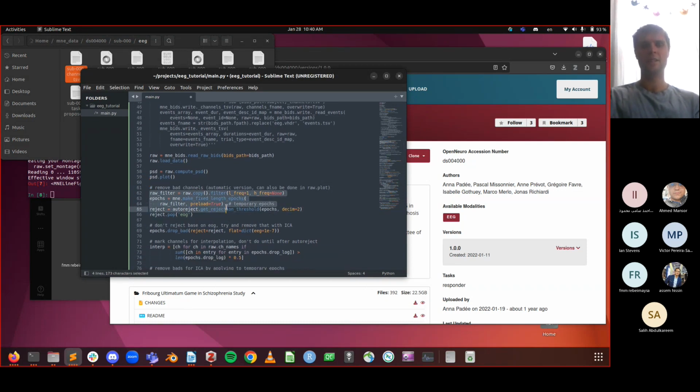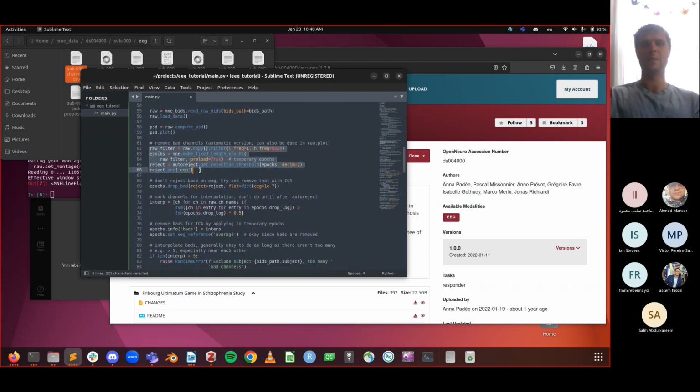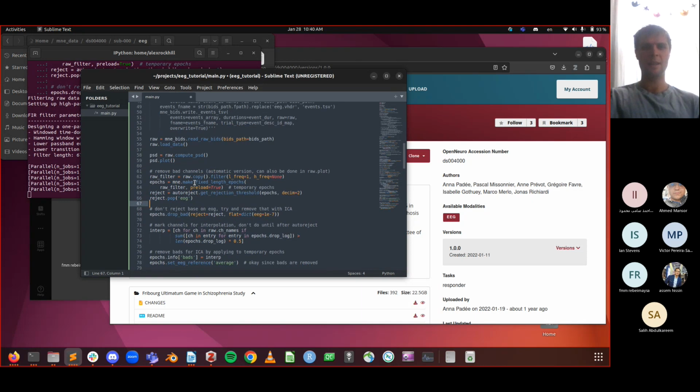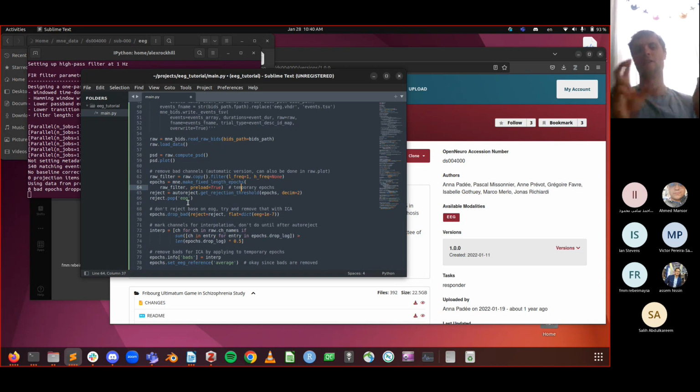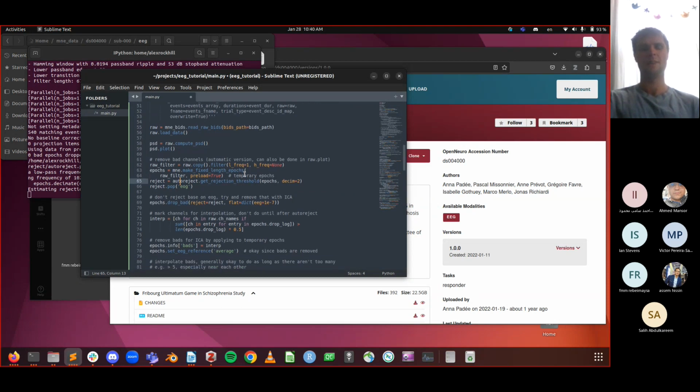And then I just did this global rejection threshold, like I was mentioning, so that when we do the ICA, it's filtered, and there are no large artifacts and movements. So we can make some temporary epochs that are just fixed-length epochs, like 2 seconds each, so that the epochs can get dropped where they were moving and grossly affecting the channel, so that that doesn't go into ICA, since those will just get rejected.